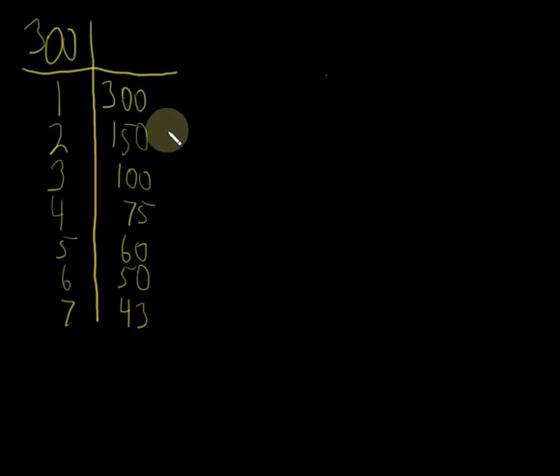But the good news is that if you remember, the normal heart rate for a resting adult is from, oops, and I did that wrong. Let me mark that out in the wrong spot. So it is from 60, so let me do it from the right side here, from 60 to 100. And this one is going to be a normal sinus rhythm. If it meets all the characteristics of sinus, has a heart rate between 60 and 100, that's what we expect. That's a normal heart rate. That's a normal sinus rhythm.